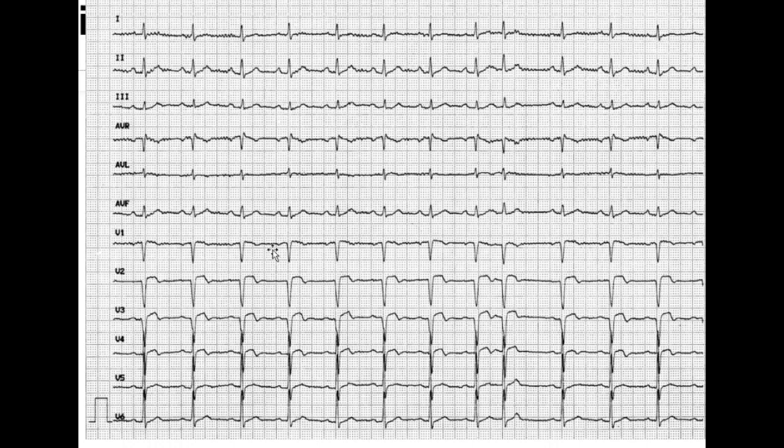The ninth QRS complex is actually an extrasystole. The way you would find this out is if you checked, for example, lead AVF. You can say it out in your mind like PQRST, PQRST, PQRST. When you get to the eighth QRS complex, you'll see that there's a PQRST, but then there's suddenly another beat without any P wave, and then it's followed by a T wave and then a long pause. So this is basically an extrasystole. It's an interference in the normal ECG tracing.